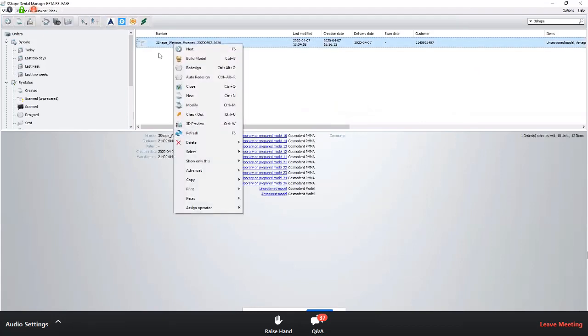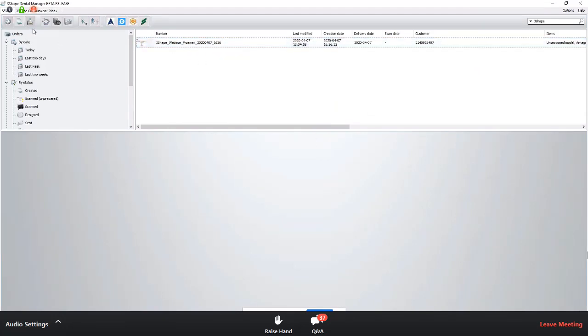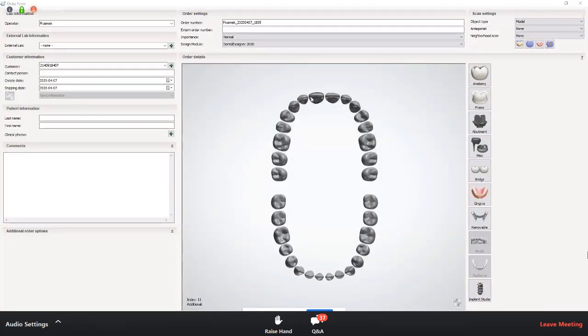If we're doing a new case, normally what I'm doing is, let's do a quick new case here. I'm going to show you how to use this, because also if the doctor preps, then you can use this as well. So I'm just going to do the two centrals, just for fun.